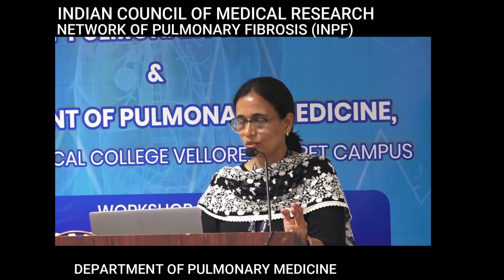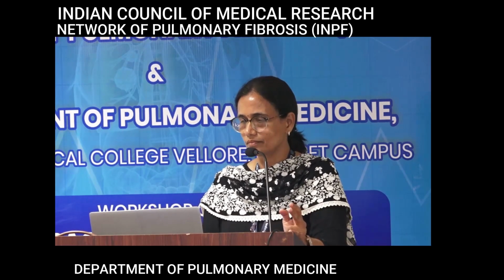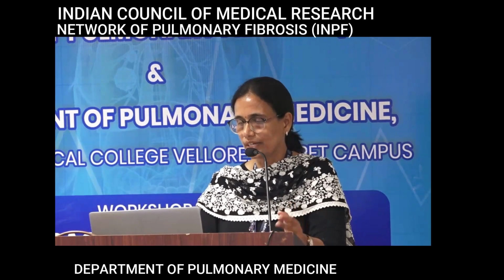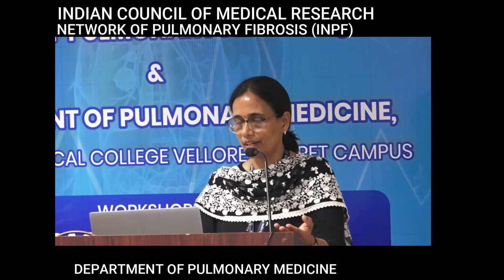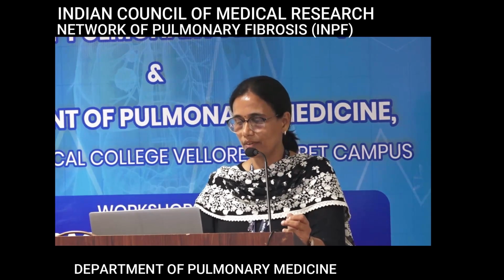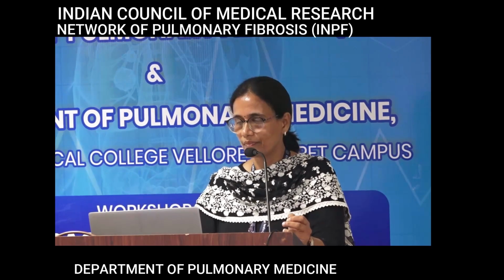What about this one? So basically is a smoker. Lot of ground glass opacities, some cysts are there. So we can think of, when there is lot of ground glass opacities, again it is an alternate diagnosis, and this is an example of a DIP or desquamative interstitial pneumonia.